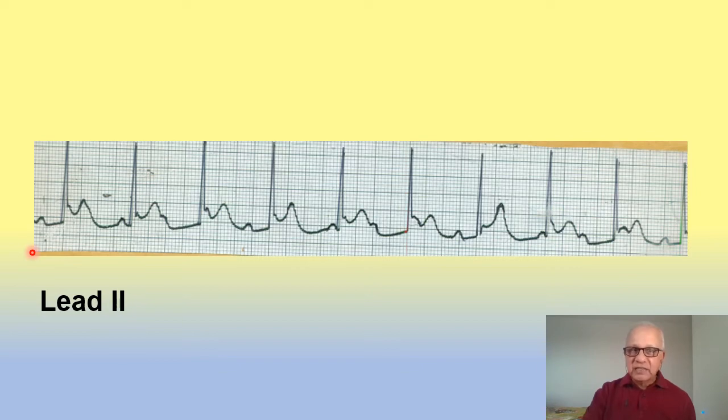Now this patient gave the symptoms of retrosternal pain on deep breathing and swallowing. These are two classical symptoms of pericarditis. That is, the patient gets deep pain, right? When he takes a deep breath, he gets a retrosternal pain. And similarly, during swallowing, sometimes even during sneezing and coughing. And similarly, if he bends backwards like this, the pain increases. Bending forward relieves the pain to some extent. Now these are some signs of pericarditis. Read about pericarditis in some textbook of medicine. So this was a classical case of acute pericarditis.